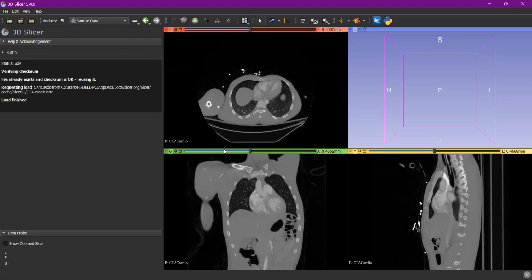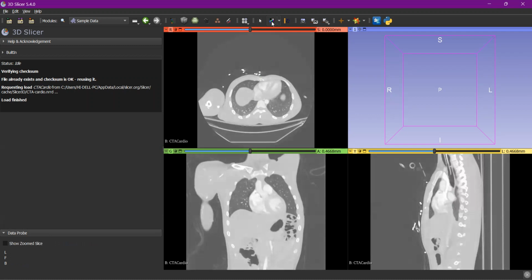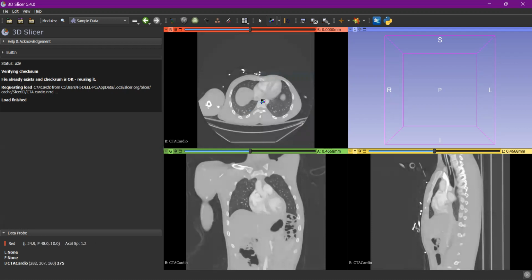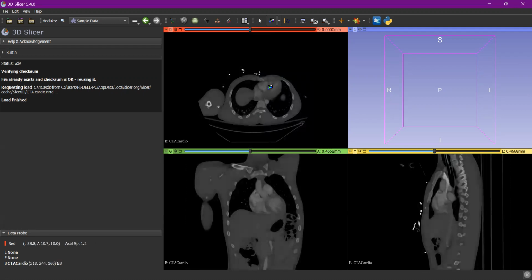Before mentioning anything, I would like to explain contrast, which is important. By clicking this contrast menu over here, we can adjust the contrast of the image. Some regions may be highlighted, and we can adjust the contrast based upon the view and every slice. So I'm choosing this contrast here.